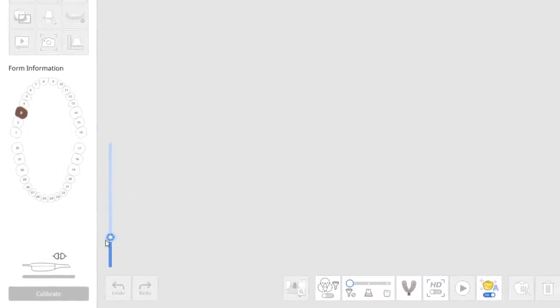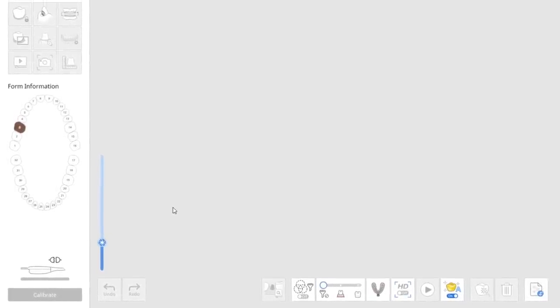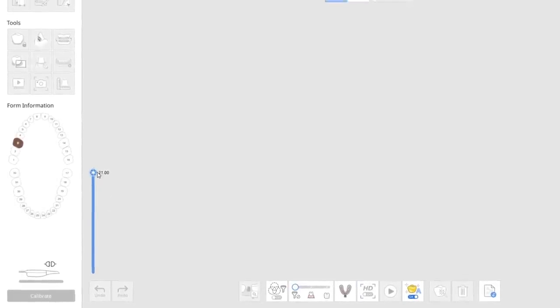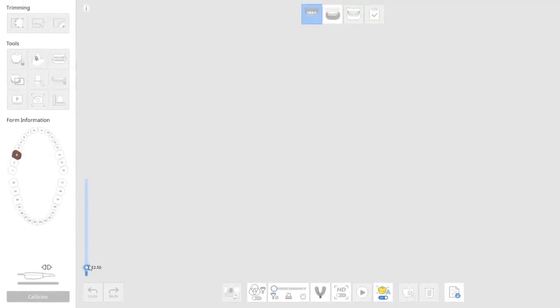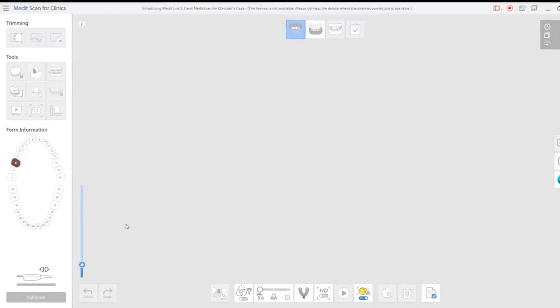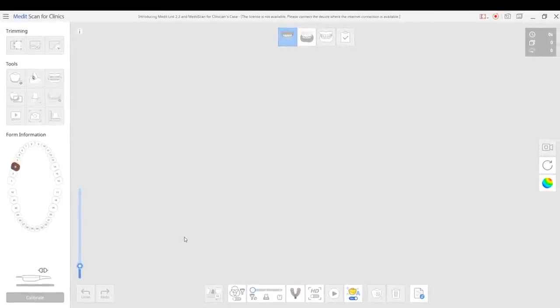We could spend days talking about how to utilize this. It's a very popular function amongst advanced users. You can also use the very high setting for deep margins if you want to. And for new users, I mentioned you can keep it at low setting so that you don't get distracted by the tongue and the lip, which is the constant issue with taking digital impressions.